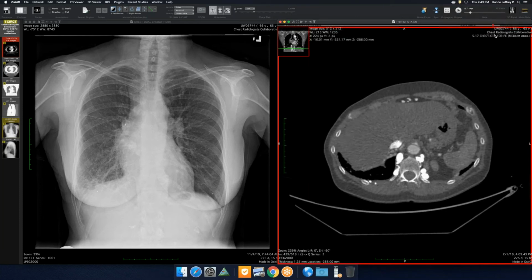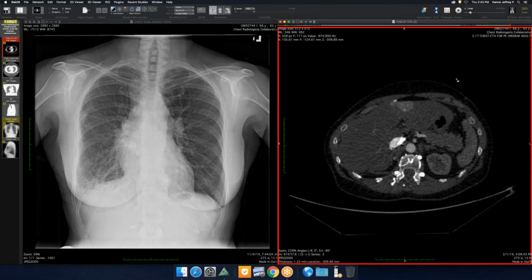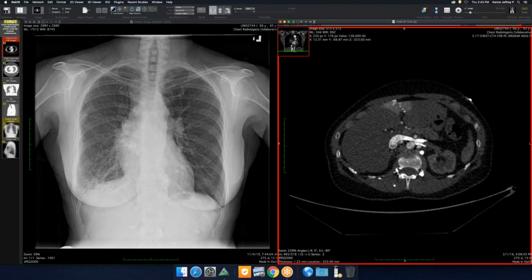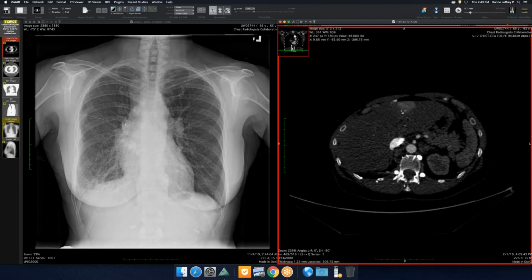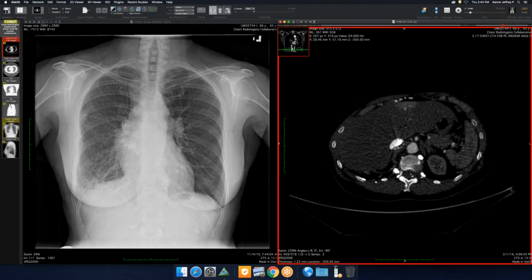And I know David would ask me about calcifications in the spleen. And then you can see there's a really nice so-called hot quadrate sign in the liver with a bunch of venous collaterals in the abdomen. And then the plexus of the spine as well. But yeah, good point about that collateral flow there, Howard.